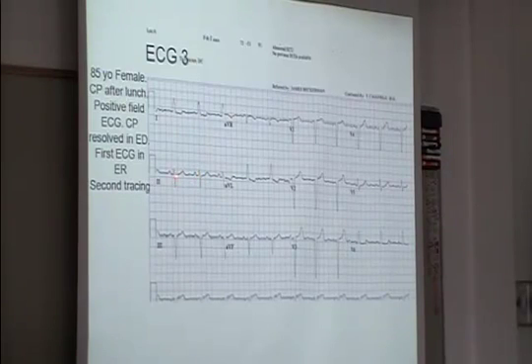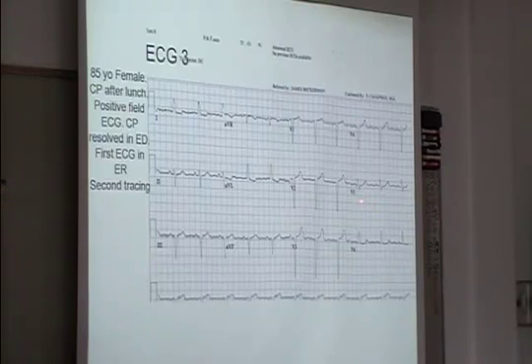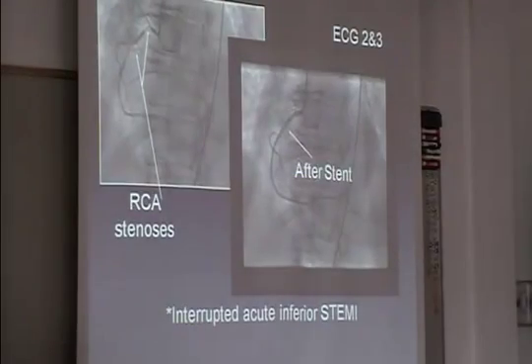So this is lead 2. There's really no ST elevation there. And the precordial leads here, like I said, if you use a 2mm cutoff, it's just not very specific. It's a little hard to tell, but clearly better than this one. So you see that dramatic change, so you know, we'll think, why is that? The aspirin and nitro you gave the patient, the drug.